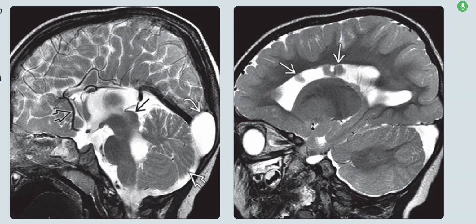Starting with the cases of Aicardi syndrome. Aicardi syndrome imaging descriptions. So the left is a sagittal T2 weighted fat suppressed MR scan in a 4-year-old female with a known history of Aicardi syndrome and coloboma with chorioretinal lacunae, and it shows near complete agenesis of the corpus callosum with an azygous ACA.